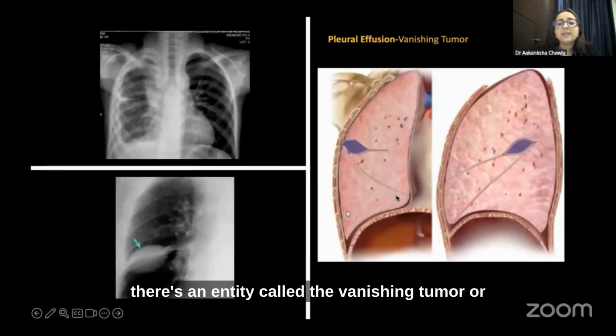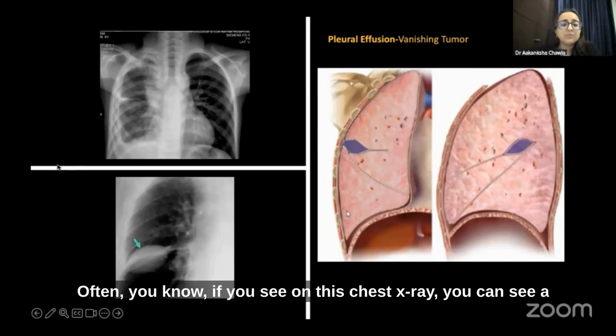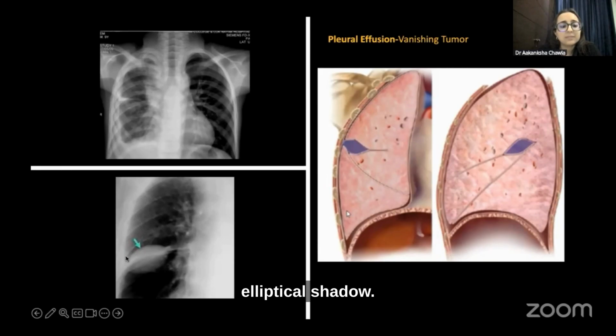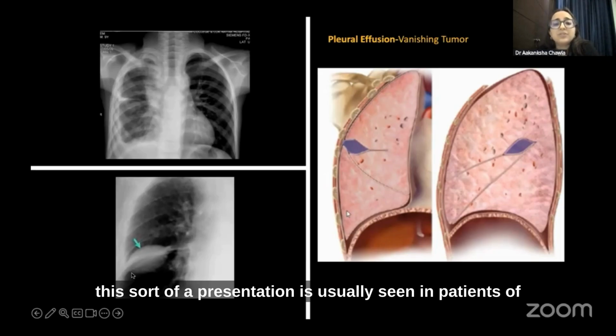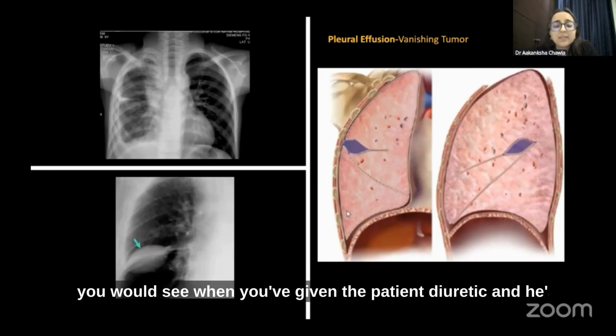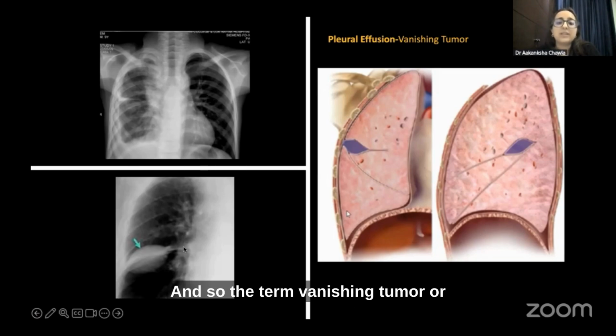Now, there's an entity called the vanishing tumor or the pleural pseudotumor. Often, on this chest X-ray, you can see a thorn-like opacity through the fissure, or you can see this elliptical shadow. This sort of presentation is usually seen in patients with congestive heart failure, very responsive to diuretics. When you've given the patient diuretics and he's adequately decongested, the next day you would see that these shadows have suddenly disappeared overnight. Hence the term vanishing tumor or pleural pseudotumor.